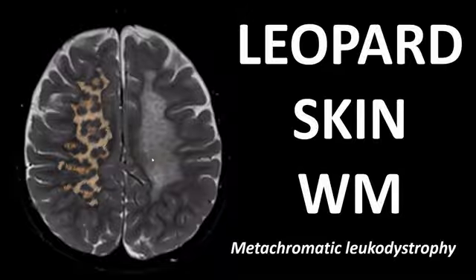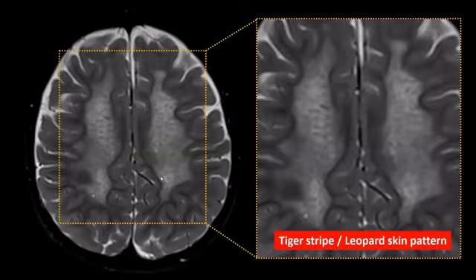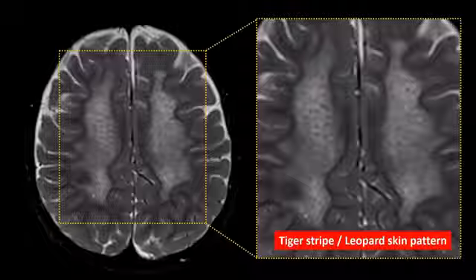If it looks more like spots to you, you can call it the leopard skin sign instead of the tiger stripe sign. So whatever you call it, if you see this pattern, either tiger stripes or leopard skin, think metachromatic leukodystrophy. But remember, it's not 100% pathognomonic for this rare disorder, but at least it puts you already on your way in the category of the toxic metabolic genetic disorders.